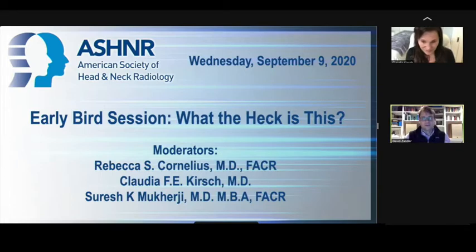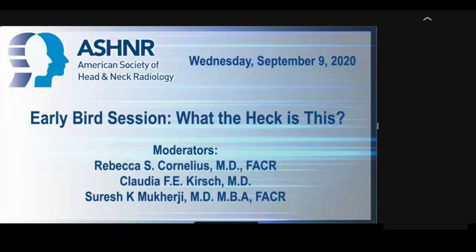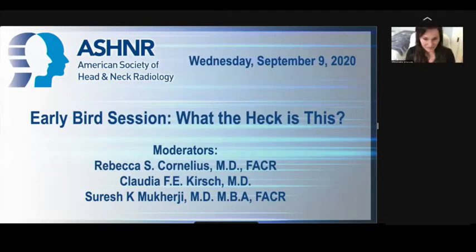Sure, definitely. I was just surprised at how abnormal the remainder of the central skull base looked. As you said, fairly pneumatized sphenoid sinuses. The cavernous sinus was just really not there at all. So I don't have a great way to explain it. And I wonder what we could do for this patient with her trigeminal pain. I don't know if there's much we could offer.